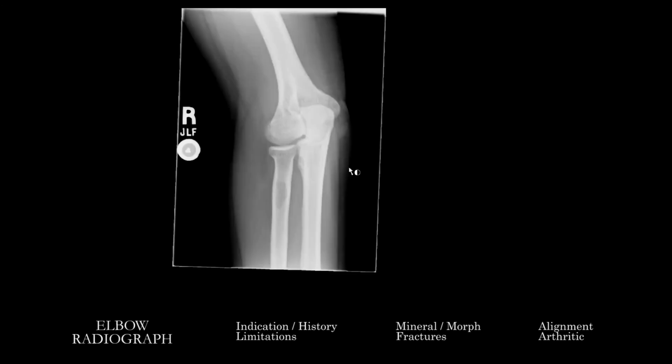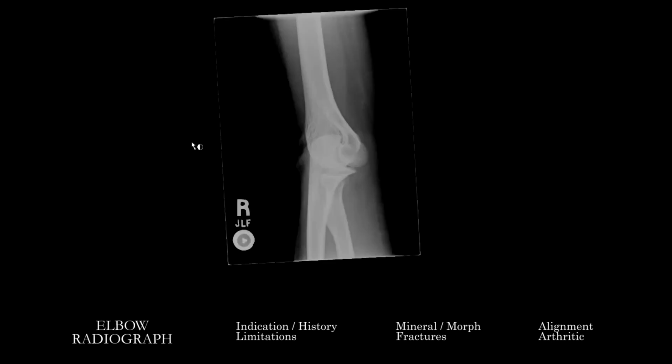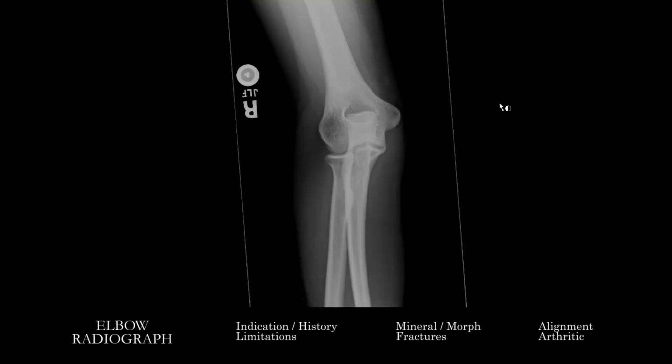in addition to the more characteristic distribution of osteochondral lesions at the capitellum. But just keep in mind that we want to make sure that we scan all the osseous structures for any sort of abnormality there. And as we wrap up the study, you want to make sure you're correlating across every single view and being aware that sometimes you can only see a fracture well on a single view. So again, we have to be careful and go through the search pattern for each single view.